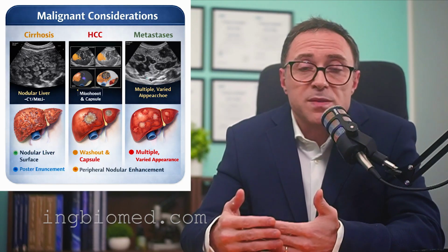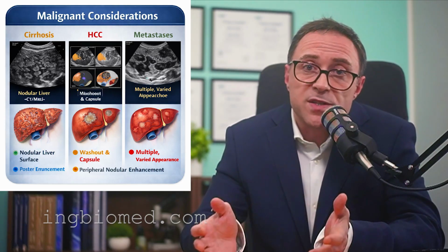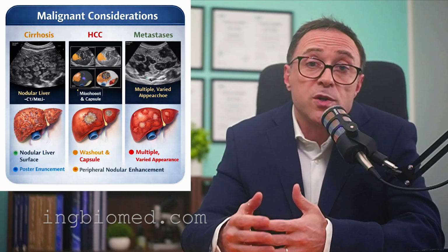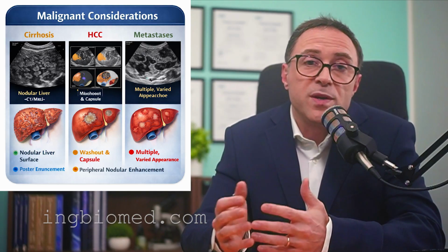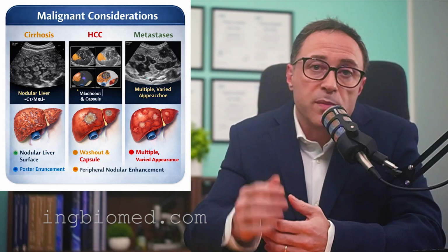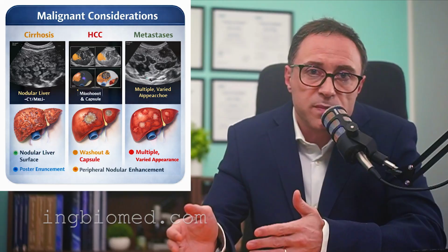Finally, metastases may present with variable echogenicity. Hypovascular metastases, such as those from colorectal carcinoma, frequently demonstrate early washout in the portal venous or late phase, appearing hypoechoic relative to the surrounding parenchyma. Understanding vascular behavior is essential for differentiation between benign and malignant lesions.